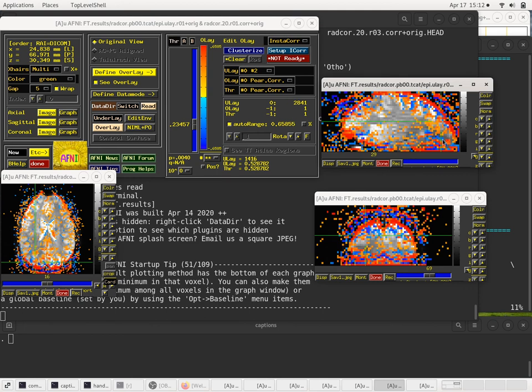That's like a full width at half max of 40 millimeters. Full width is more of a diameter, but it's more natural for us to ponder in terms of a radius. So it's a 20 millimeter half max radius Gaussian weighted spherical average that we're correlating against.